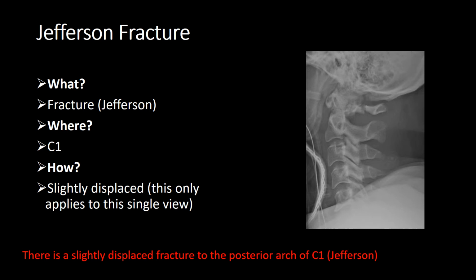So what is it? It's a fracture, Jefferson's. Where? C1. How? Slightly displaced. Now we only describe it as slightly displaced on this single view.